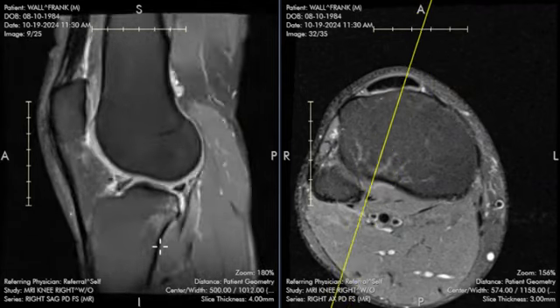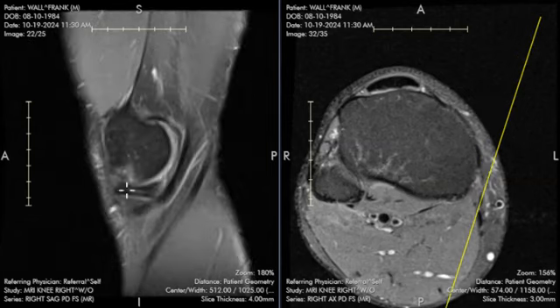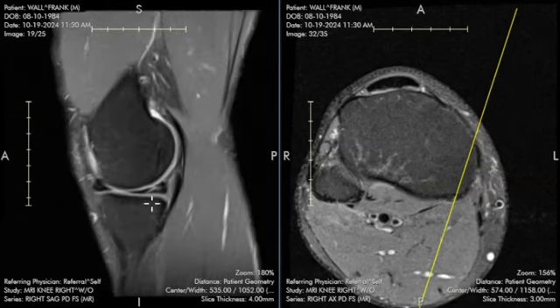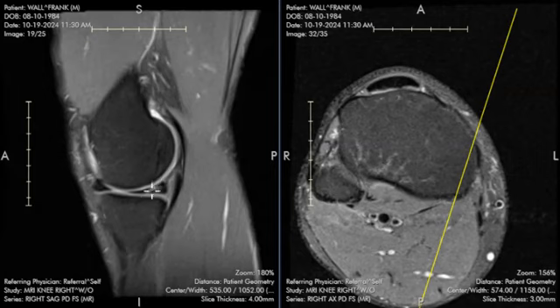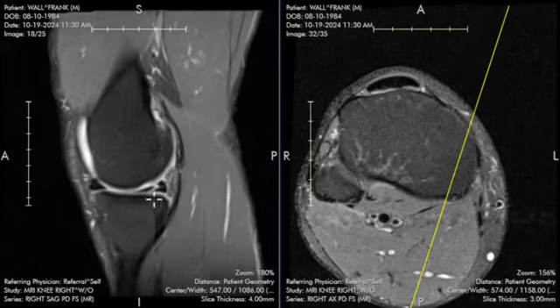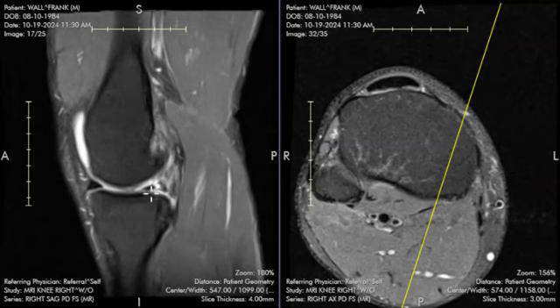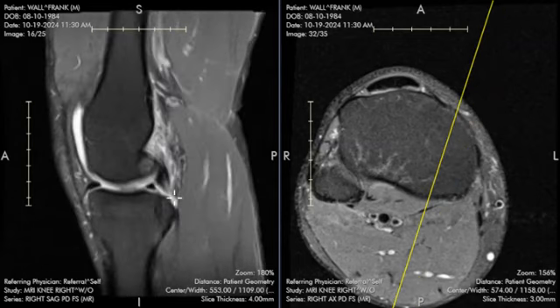Next, I noticed that there is another tear, this time of the medial meniscus. There are two menisci in the knee, by the way, one on the medial side and one on the lateral side. So this is the medial meniscus. Typically, when it's healthy and normal, it looks like a black triangle like this, but you can see this vertical tear running through the posterior portion of the meniscus. So the inner third here inserts normally at the posterior root, but the peripheral third tears completely.